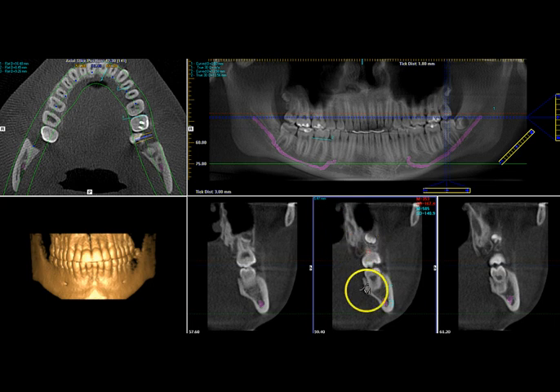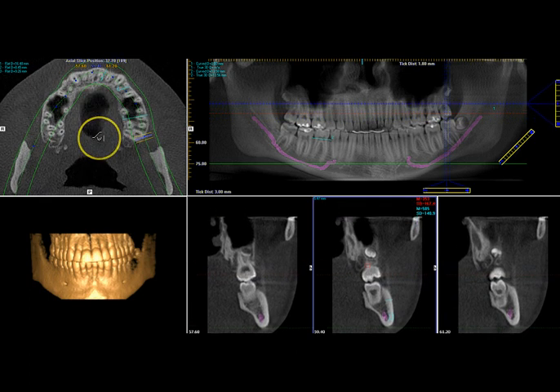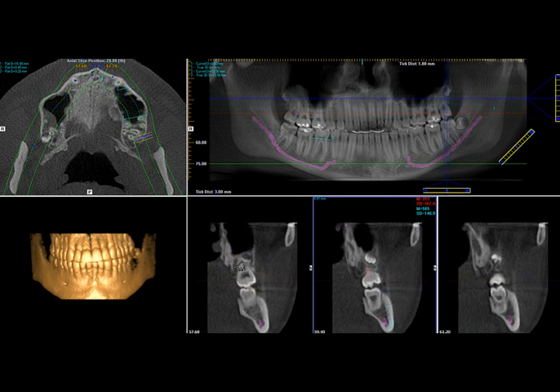I want you to understand what this is in a regular pan, because you're so used to seeing this. You should know that this line right here would be a slice right here, and this would be the cross section, this will be the height, okay? And you'll know what this is. This is the axial view from down up, right? So this is the coronal part of the teeth, and we're slowly going down. All right, so this concludes our radiographic evaluation. Thank you.